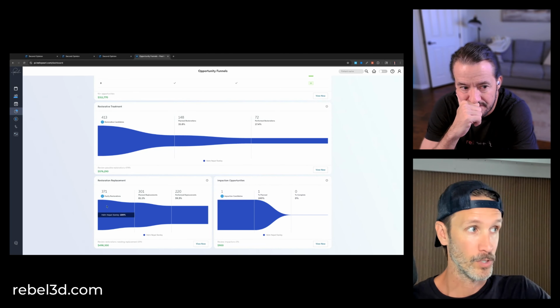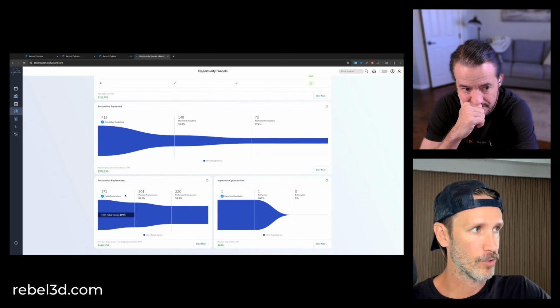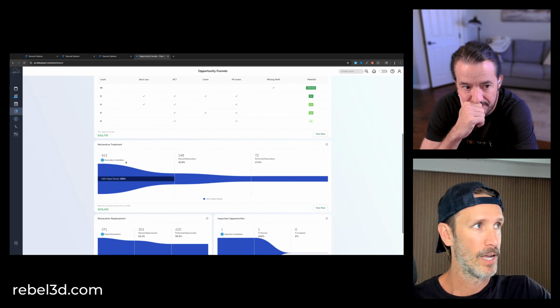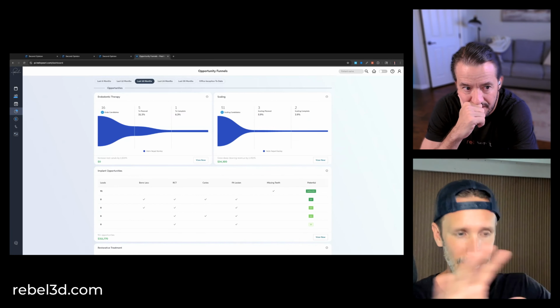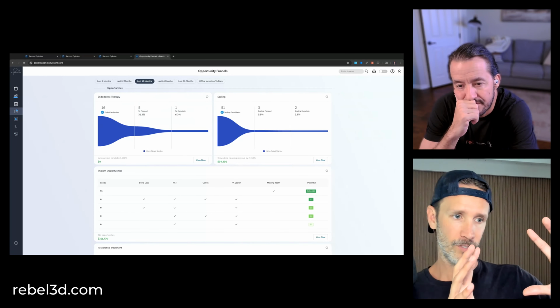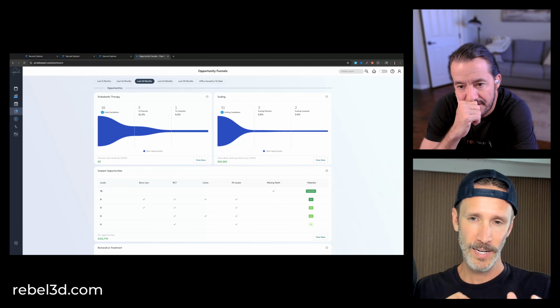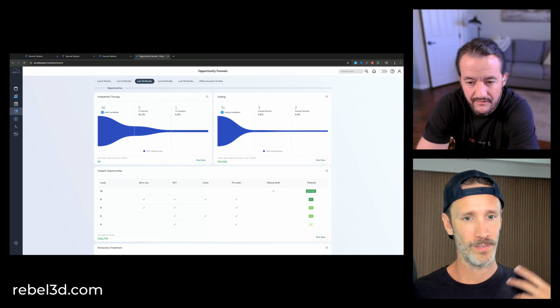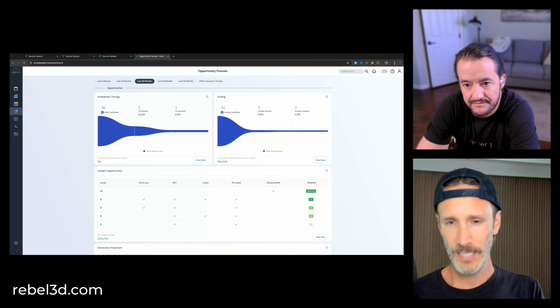But restorative, there's a ton. Oh, sorry, this is restoration replacement. So this is when patients have previously open margins, and this is more around caries. So it's taking the entire data set because the radiographs, we get all the data from it. It's like what Google does with the internet, how it makes it queryable. So you can go look for a specific type of patient. Let me look for a patient that has bone loss and that has caries and this or that.